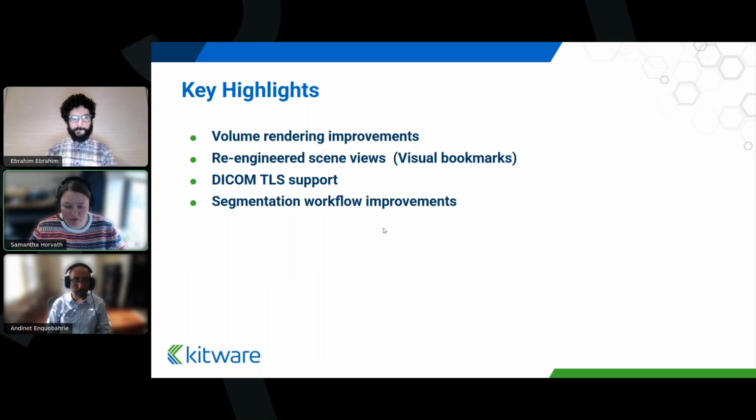We've also made several segmentation workflow improvements, including segment visibility toggles, better terminology handling, and these quality of life improvements reduce friction in what is really our most used interface, the segmentation editor. We've completed and really solidified our Python 3.12 update.